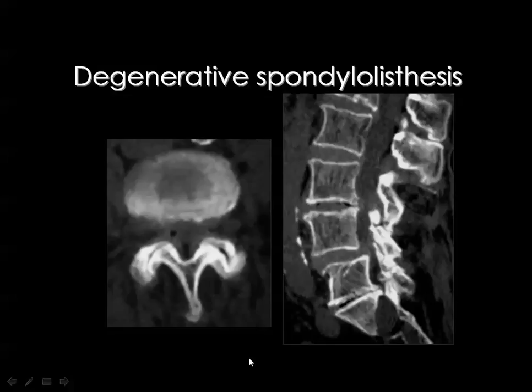Then, if you are dealing with a first degree spondylolisthesis, you have to discriminate between degenerative and lytic. You should look for whether the pars is broken or the facets are the seat of osteoarthritis. One of the simplest ways to decide this is just to look at the facet joints.